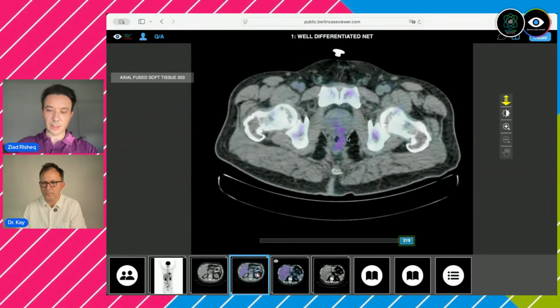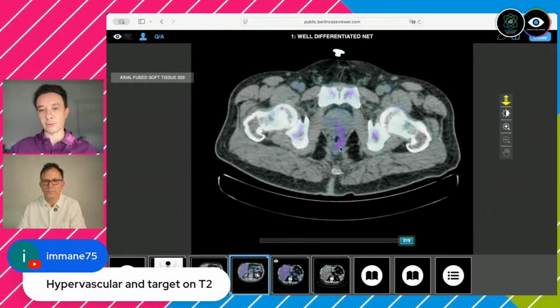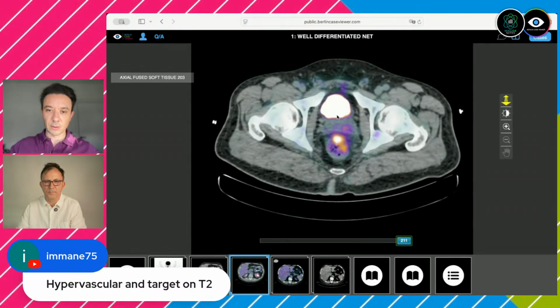It is not showing uptake. So it's basically a heterogeneous lesion showing regions of high grade, regions of low grade. So this is why you see this difference of uptake. Some of the lesion probably is beyond the resolution of PET as well. So you see this heterogeneous pattern of uptake, but a definite diagnosis, you need a histopathology. But based on the patterns that you see, you can make a most likely diagnosis. Nonetheless, he needed an endoscopy or to repeat the lower endoscopy.